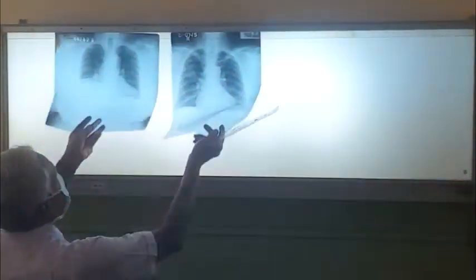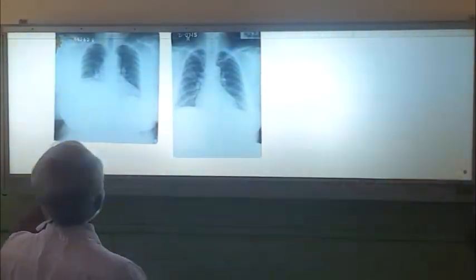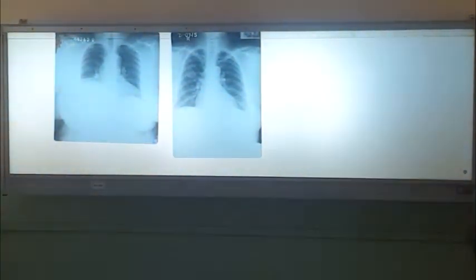The cardiac shadow is a little bit rotated here, shifted here. You have to palpate here and see whether there is pectus excavatum. Basically, I have most of the lung pathologies, so go and read everything, right?